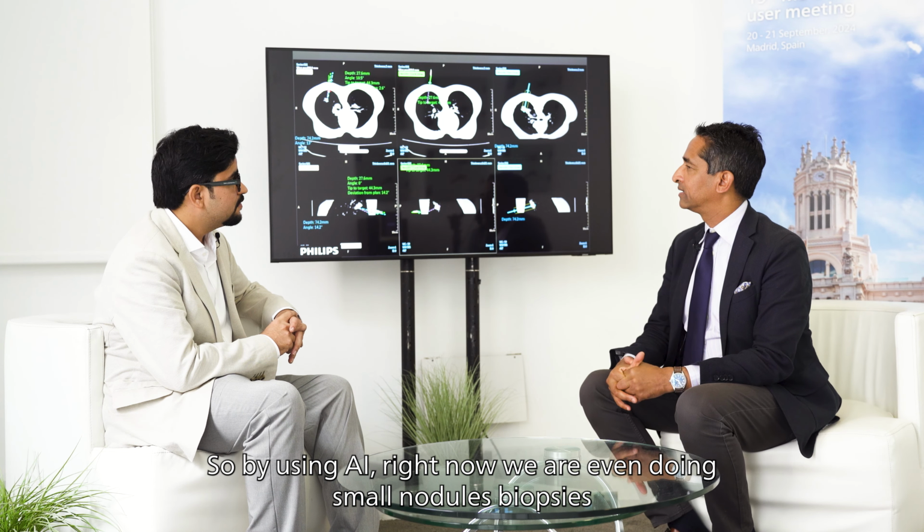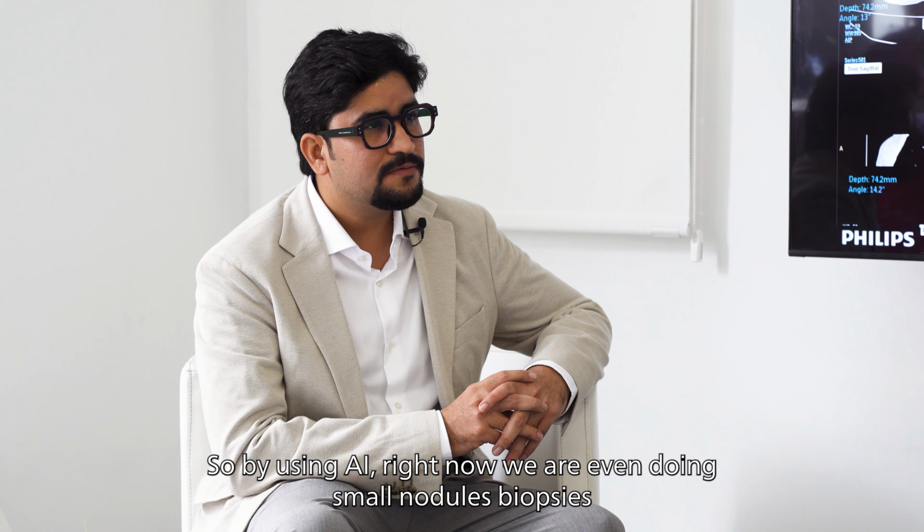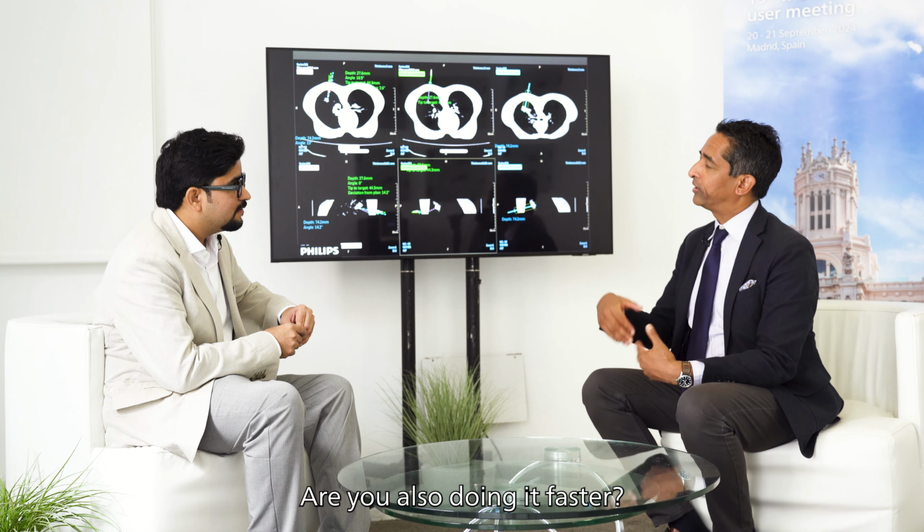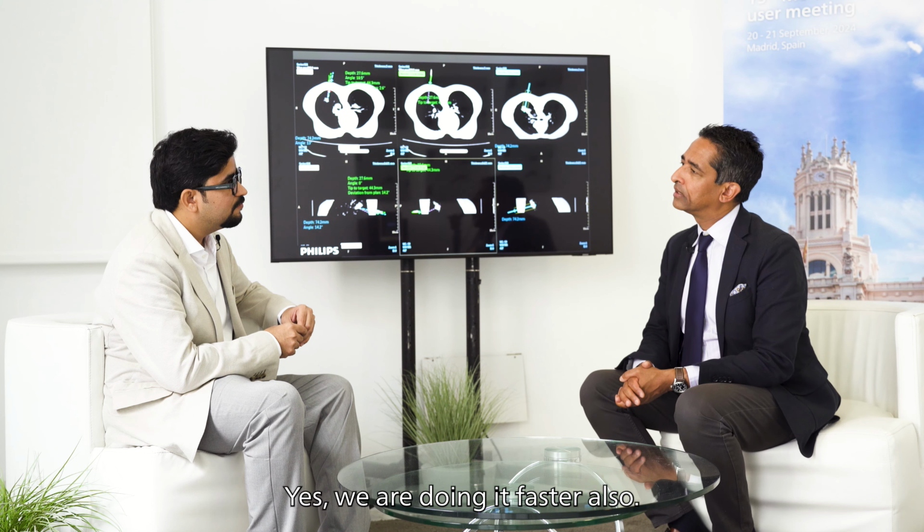So by using AI, right now we are doing even small nodule biopsies, which are around 4 mm or 5 mm, without multiple passes, because if you are doing multiple passes through the lung, it is going to cause problems to the patient. More pneumothorax, more pneumothorax. So you're doing 4 millimeter nodules, 5 millimeter nodules? Yeah, we are. Are you also doing it faster? Yeah, we are doing faster also.